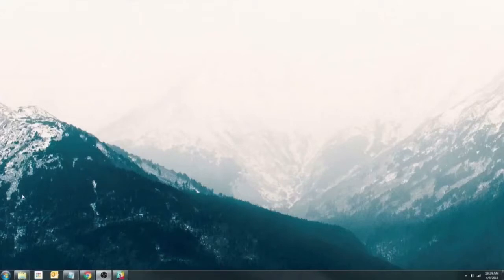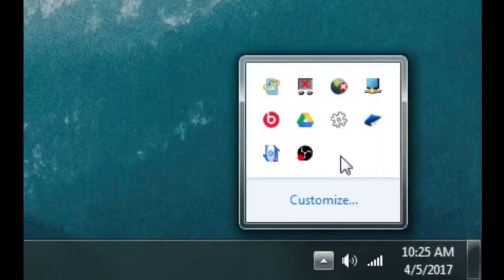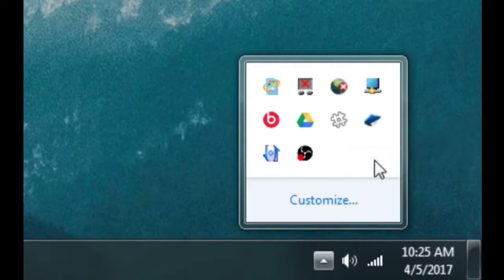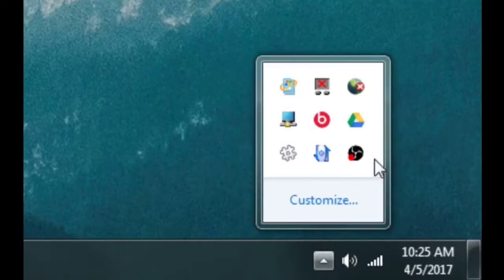Note that the viewer is still running in the background, waiting for a new study to be opened. Exiting the viewer is performed in the task tray. This is done by right-clicking the notification area icon for Practice Builder and clicking Exit. Then, exit any other application, such as the Philips Device Control Center, which may be keeping the Dragon connector open.